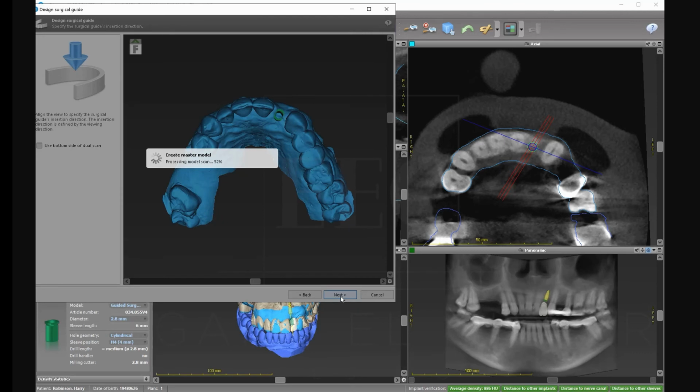So the inconvenience with that is you cannot put the implant guide in. But in BLT, it's not self-tapping, so the implant will always be in the same direction that you did the osteotomy. It cannot change. If you are in BLX, it's a big problem.